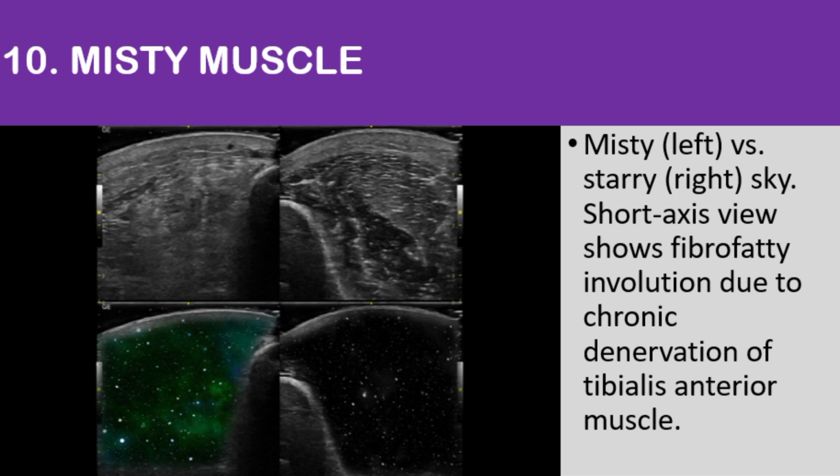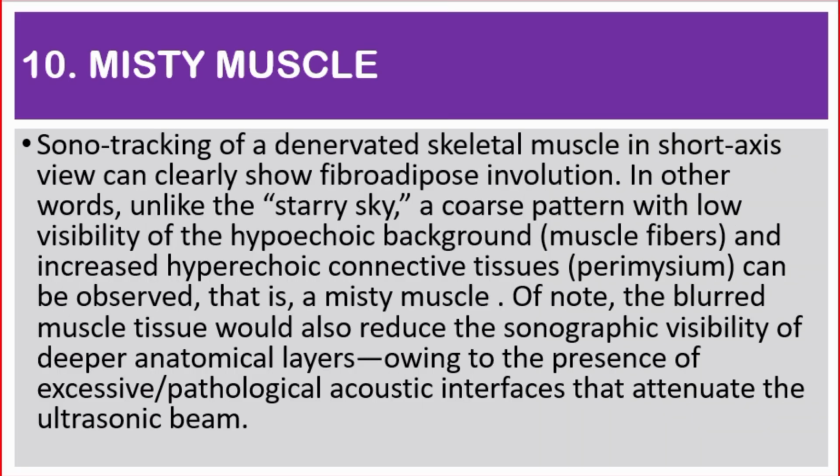Of note, the blurred muscle tissue would also reduce the sonographic visibility of deeper anatomical layers, owing to the presence of excessive and or pathological acoustic interfaces that attenuate the ultrasonic beam.